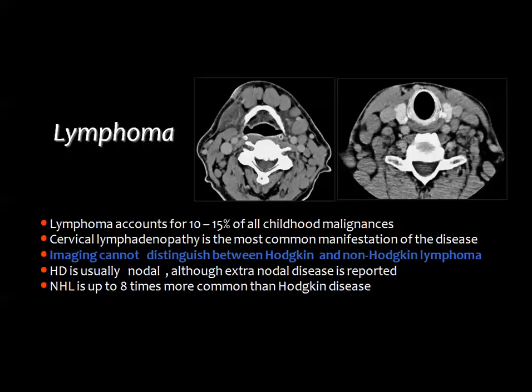they are amalgamated, they show homogeneous enhancement, and they do not contain calcium. Actually, you know that you cannot diagnose by imaging or differentiate between Hodgkin and non-Hodgkin lymphoma, but you remember the best way for diagnosis of lymph nodes for sure is to have the fine needle aspiration biopsy guided by ultrasound, especially. And here you know that non-Hodgkin lymphoma is much more common in clinical practice than Hodgkin disease.